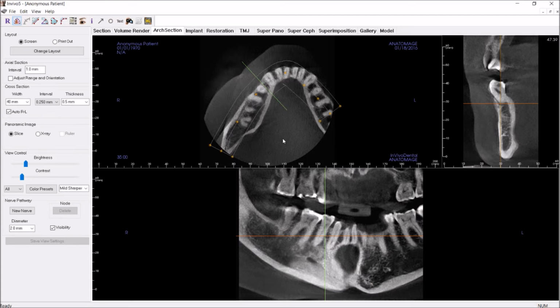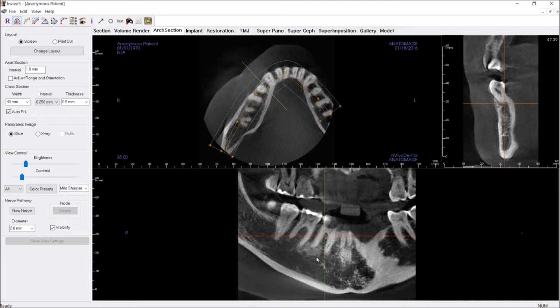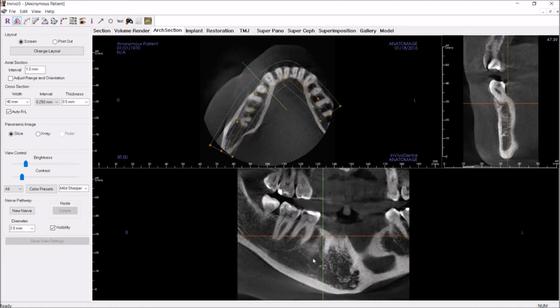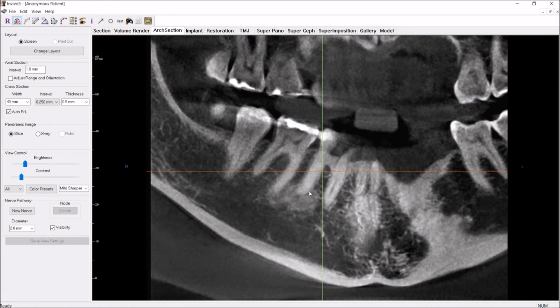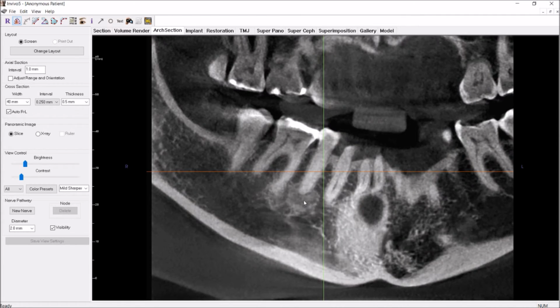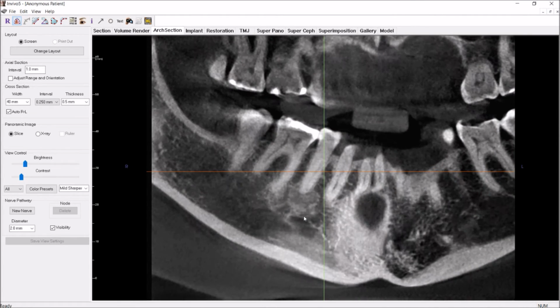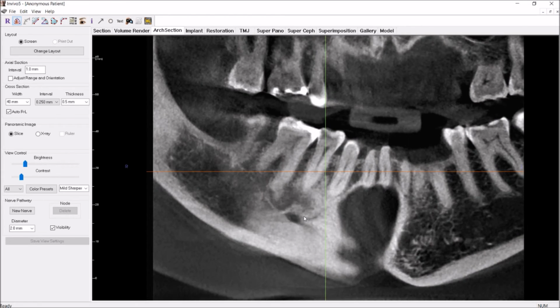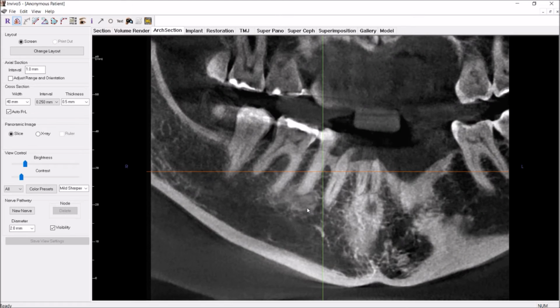Did we explain the impact it has on other structures? First of all, does it impact the teeth at all? Do you see any resorption of the teeth? Maybe you lose the lamina dura. I still think I see some PDL in here. So basically no effect on teeth, maybe effacement of the lamina dura.